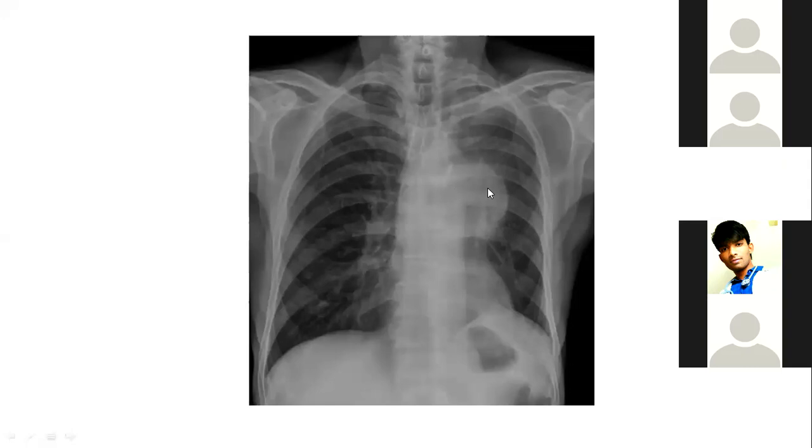So either it's in the middle or the posterior mediastinum and not in the anterior mediastinum as many of you suggested. So this sign is also important when we have to describe a mediastinal lesion. This sign is called the silhouette sign, the positive silhouette sign. We must have heard of it. So what is a silhouette sign? We'll discuss it again in the next few slides.